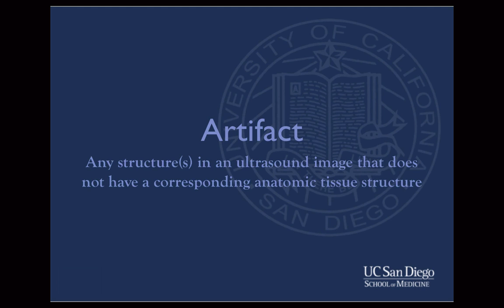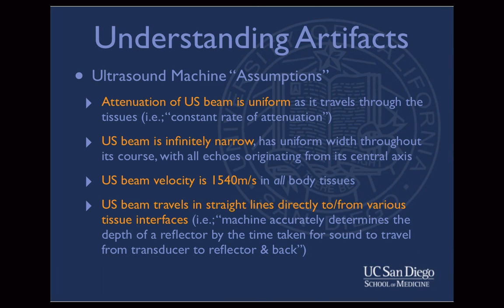Artifacts are a normal occurrence in ultrasound. The term refers to any structure in an ultrasound image that does not have a corresponding anatomic tissue structure. To understand artifacts, one must consider the basic assumptions that an ultrasound machine makes when creating an image.